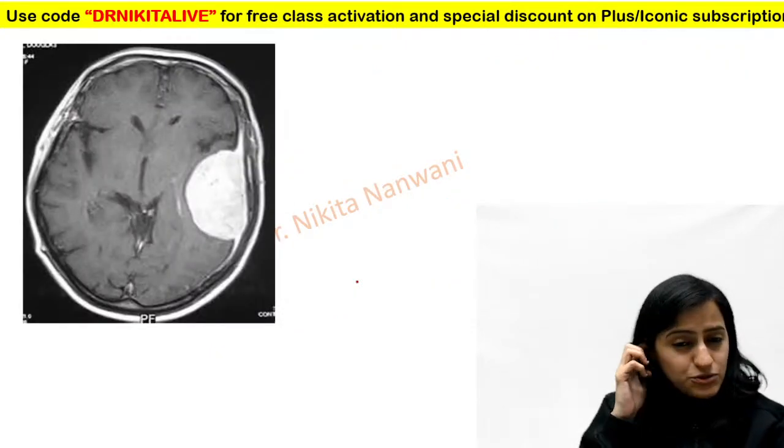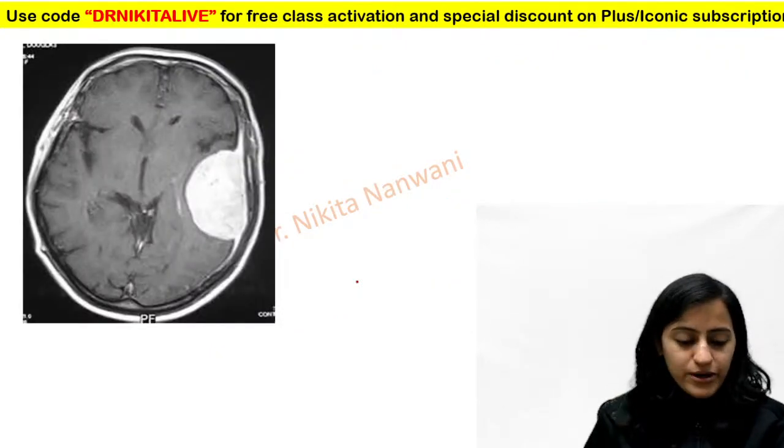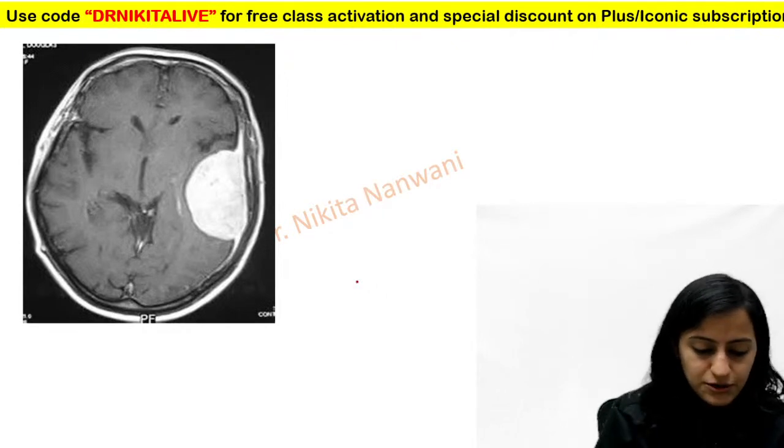Next one, coming to two brain tumors, very important. The last two images in neuroradiology. What do you think is the diagnosis here?